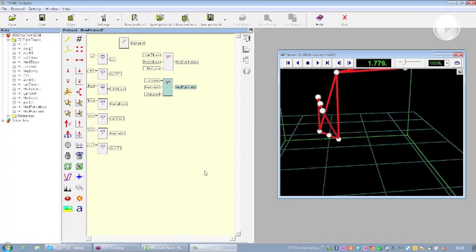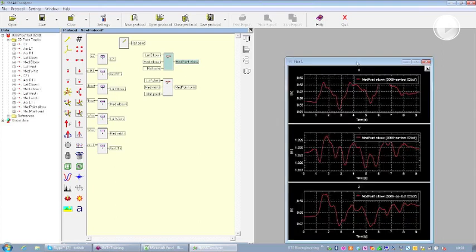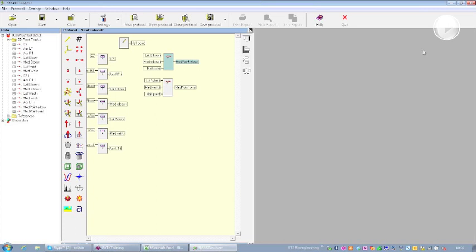Okay, as I told you before, every point, as soon as it is a 3D point, is composed of different components: the X direction, Y direction, and Z direction. Now I'm going to create the angle. Of course, this angle is going to be on just one plane. So at the end, from the conjunction of the 3 points, I'm going to get just one track. That is going to be the flexion extension angle during the complete movement.